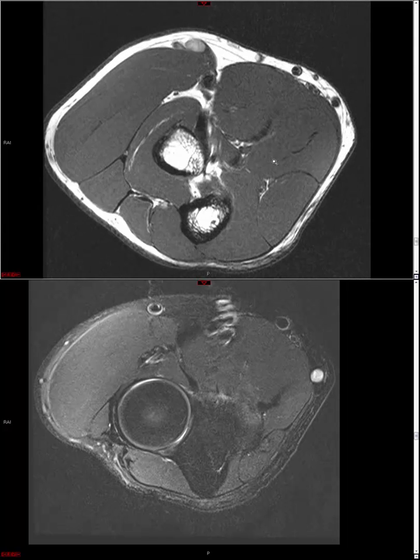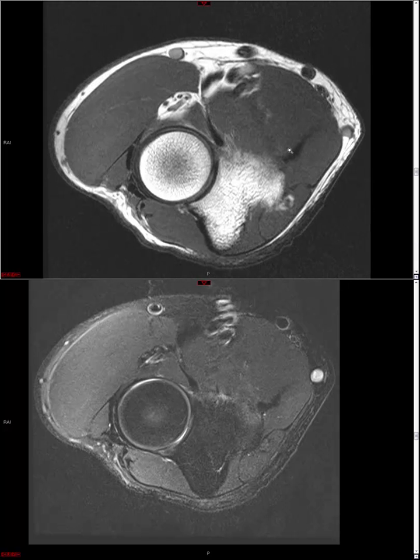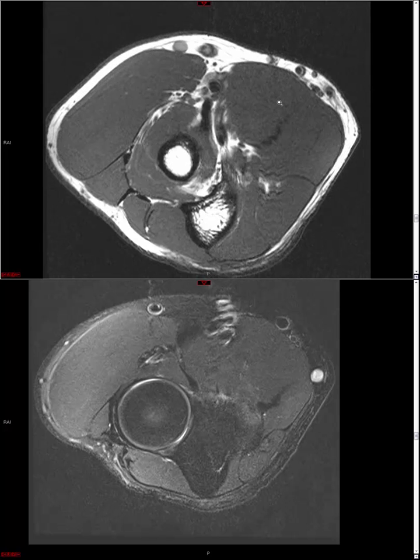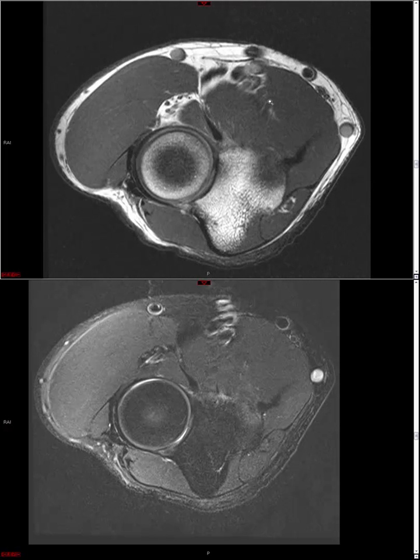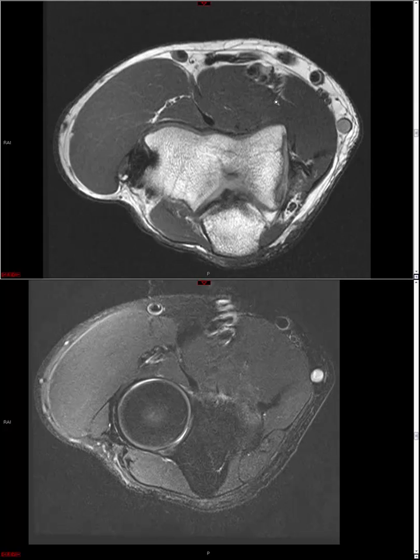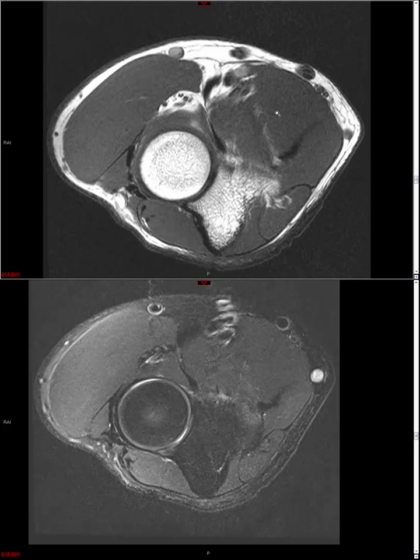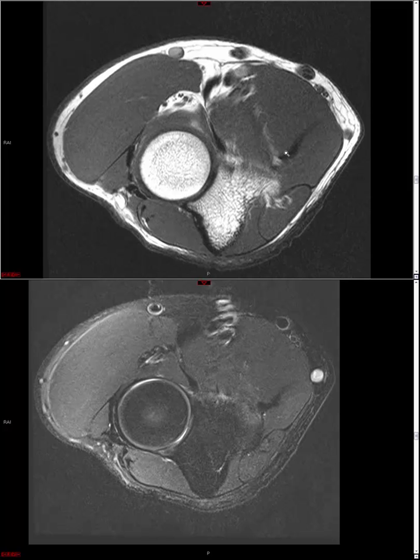We go more anteriorly, here is flexor digitorum superficialis. And then here, the big beefy extensor muscle here is brachioradialis. Alright? And that is a nice landmark for the radial nerve. Alright, so here's the oh, pardon me, this is the pronator teres. Okay, so let's see, I've got things backwards here. Yep, so let's rewind here a few steps here.